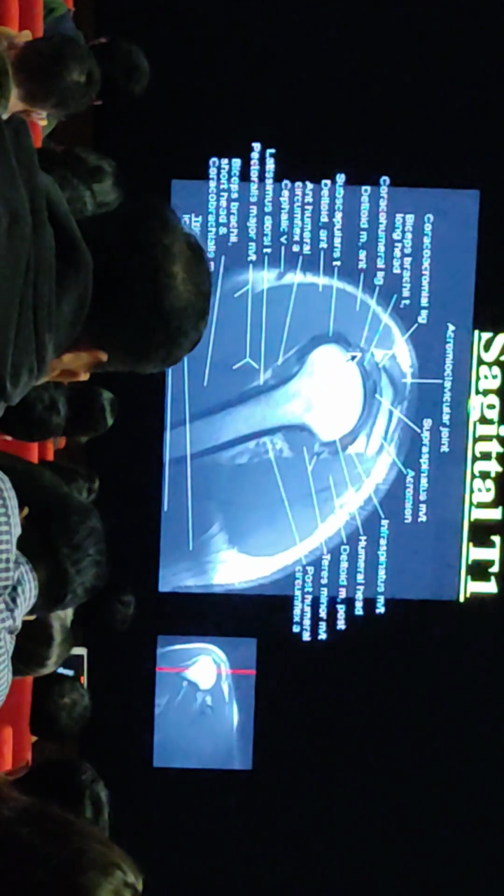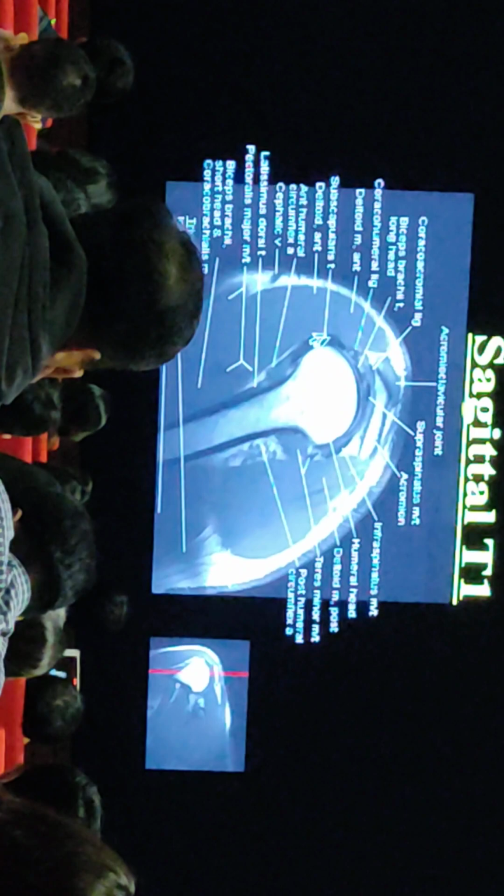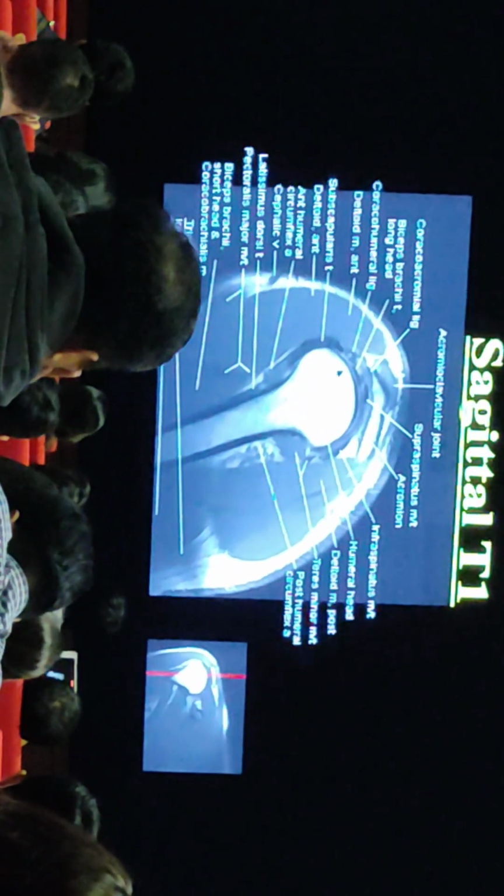And where you go slightly even towards the medial, you're going to see the rotator interval as I mentioned in my previous slide, between the supraspinatus and subscapularis, and you can see it contains the long head of biceps.